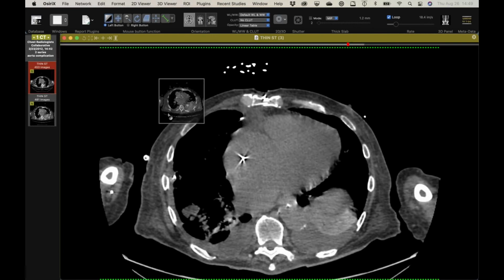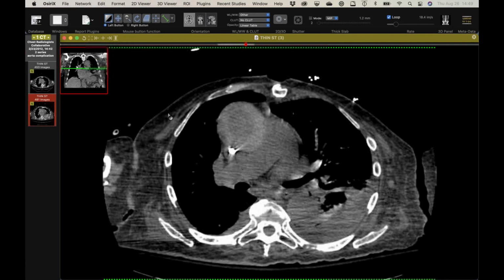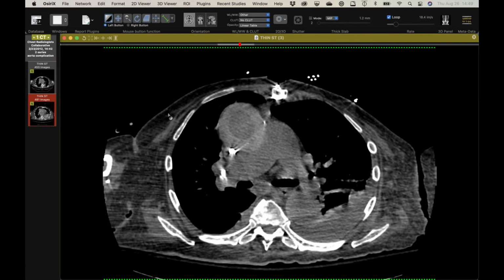You also wonder if he might have had an infection there, that anastomosis, and got dehiscence. Maybe. And then that caused. Yeah, I didn't save the CTA. It didn't show anything new. I can try to pull that down. But yeah, so this was the incidental finding I wasn't expecting to see.